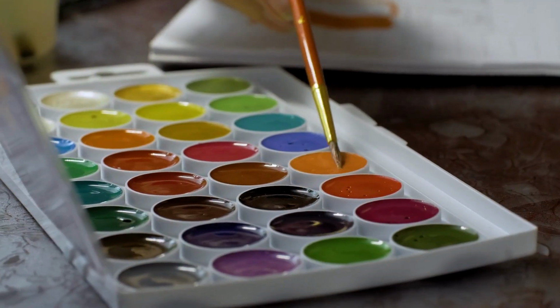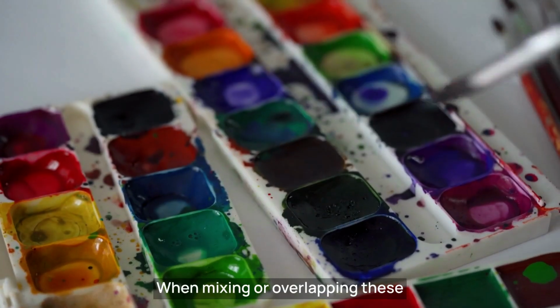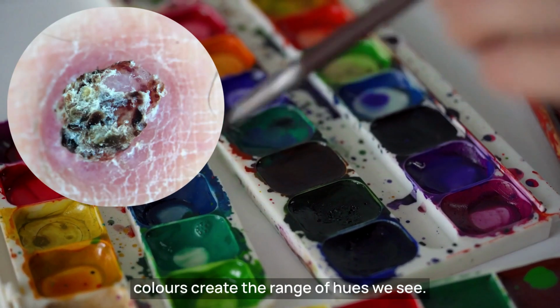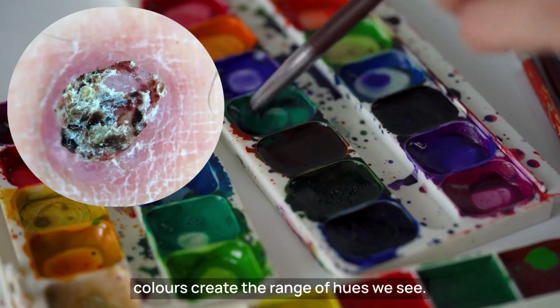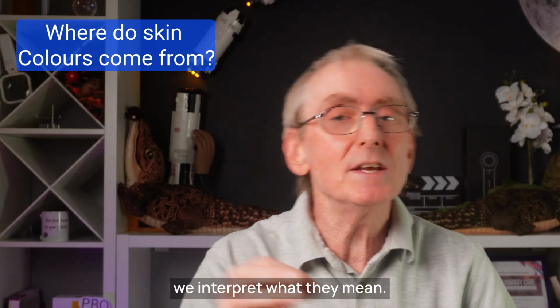The skin has its own palette of colours to work with, unless of course you add artificial colouring. When mixing or overlapping, these colours create the range of hues we see. First, let's understand how these colours are produced. Only once we know that can we interpret what they mean.